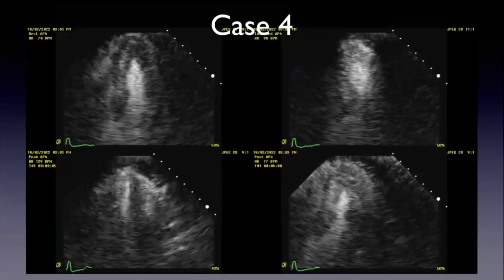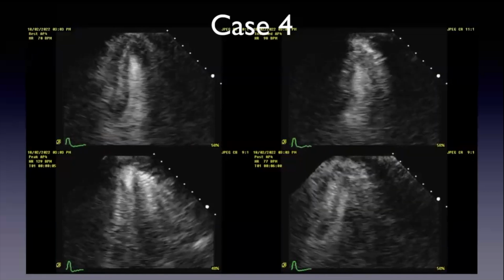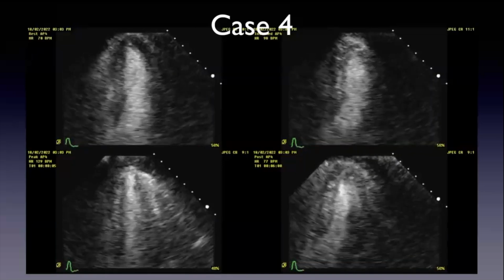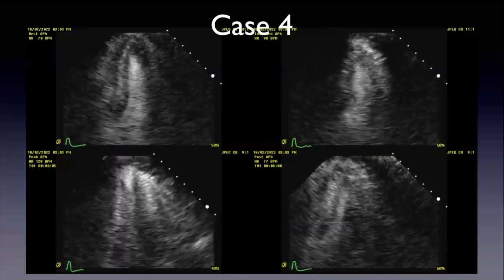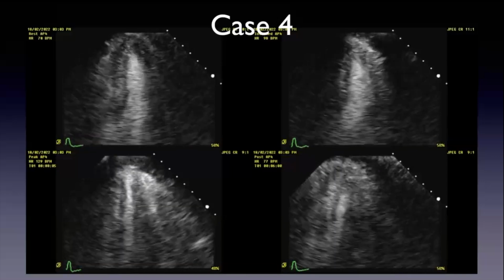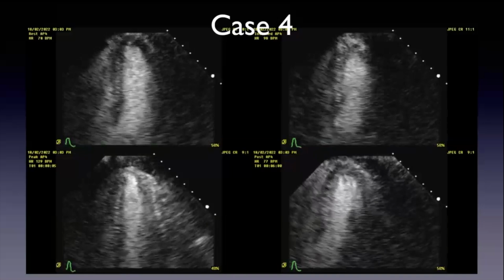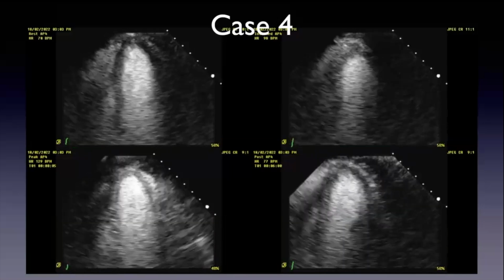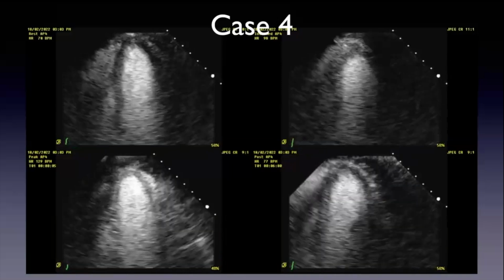Okay, so this is a stress echo. The patient was sent for a stress echo. This is a stress echo that I read actually. I asked one of the fellows to handle this one. There are only 3 fellows. Well, there's 4. I'm going to show you the apical views for the stress echo. Which of the fellows wants to take this? Don't fight. I would say it's not subtle, but it's not straightforward either. How about that? Is that cryptic enough? Talking about crypts, yeah. I can go.